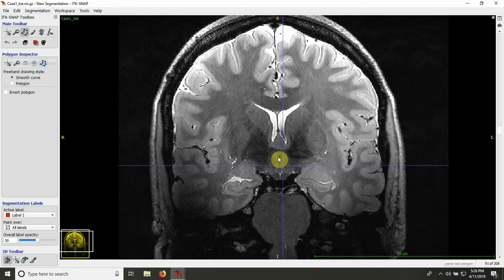And the quick answer to that is to just scroll through it and determine if you can see all the boundaries that you need for MTL segmentation. But I realize that it's complicated to assess if you don't have a lot of experience with MTL segmentation. So I'll just go through a couple of images today and explain to you how I go about it.